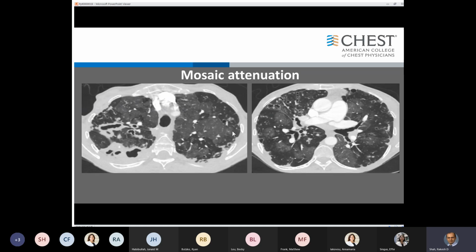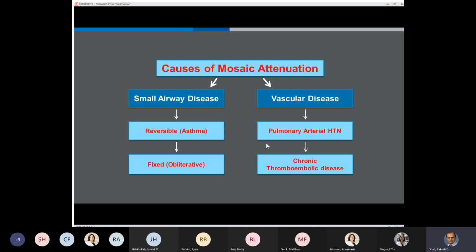As opposed to this patient where you see the lucency and the opaqueness, you can see how the borders are very sharp, right? Very sharp borders. So you know that this is normal lung, and this is abnormal in this patient who has extensive bronchiectasis, and probably this is all air trapping from a lot of plugging of the airways.